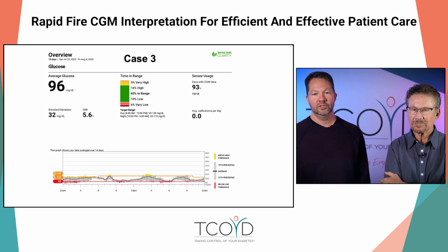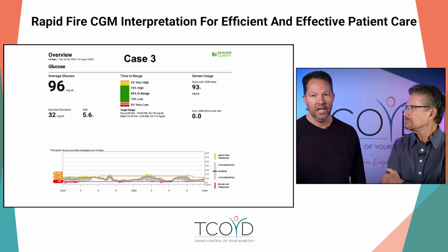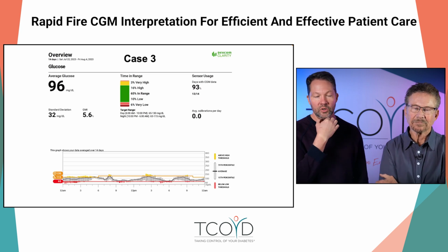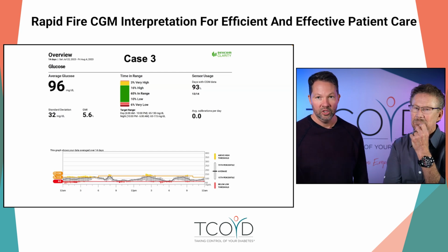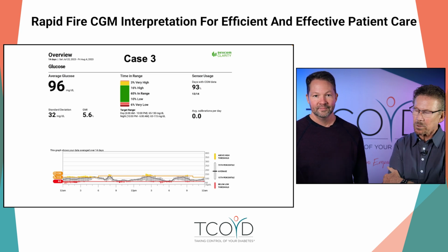So this person has a total of 16% of the day low, so it's like 4 hours a day they're hypoglycemic. And then you can see the 24-hour profile where these lows are happening essentially all the time, at night, after meals, after breakfast, after lunch. So this is somebody that's essentially low all the time. Here's the tip. It's type 1 on a hybrid closed loop system.